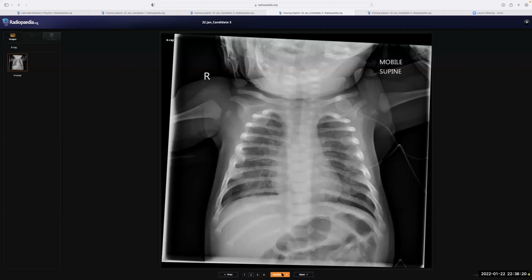I'm looking if the patient has any pneumothorax or pleural effusion. The costophrenic angles, specifically on the right side, look translucent. The patient has respiratory distress, and is 6 months old. I'm looking at the ribs. Yes, there is irregularity in multiple ribs, specifically the left posterior ribs, starting from the 4th, 5th, 6th, 7th. I think there are fractures in these posterior ribs. Also on the right side, I can see irregularity in the mid posterior ribs.